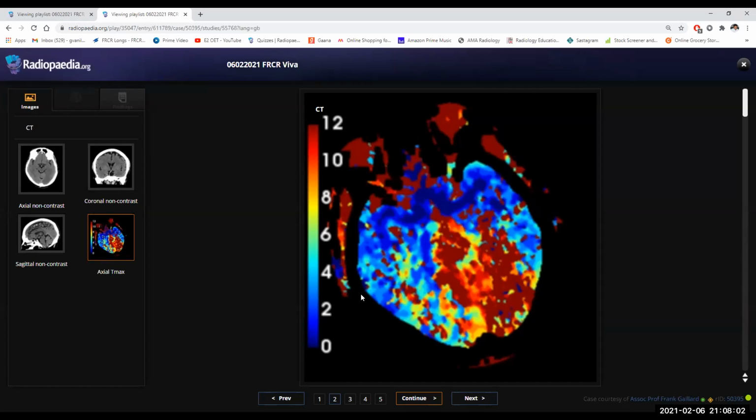I think this shows that this is beyond the, what you call it, like this cannot be salvaged now, because it has gone in the red area. But honestly speaking, I'm not much aware of this. The perfusion is showing reduced perfusion of the involved area. So this is a thrombus.